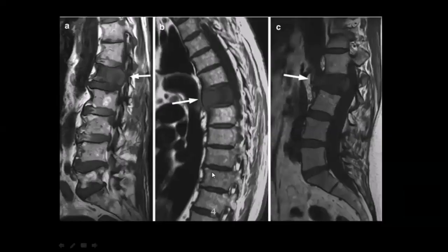Okay, so let's apply this. If there is any volunteer, tell us in this image which is favorable: malignant or degenerative? You can write in the chat, or mute yourself and let me know. We are together, we are not in a challenge, so don't worry.